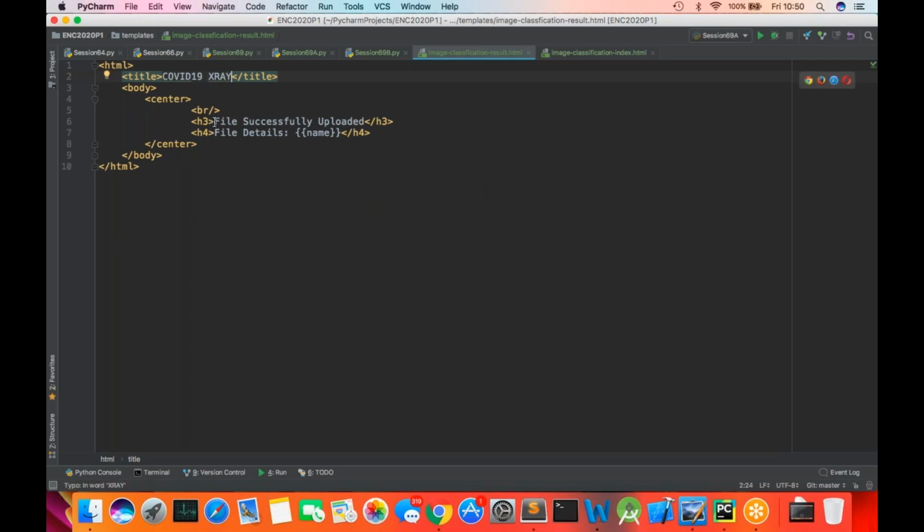I'm just going to say COVID-19 X-ray results, right? So this is something which I'm going to bring in. Here I'm going to put up this class. So what is the class? And I'm going to put the name here.